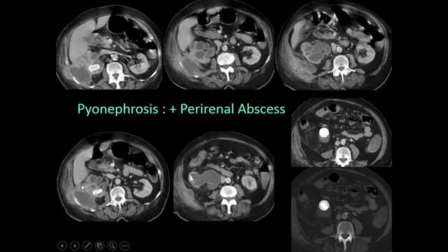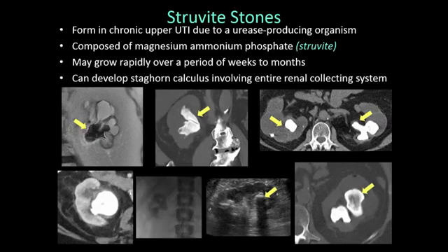It's obstructed, it perforated into the perirenal space and caused a perirenal abscess. And then the patient presents with the perirenal abscess. He had this infection for many weeks at home before he presented acutely. So that takes us just for a little bit of time to talk about stones and stones in the setting of infection. And that is the reason why urologists are very quick to take care of these stones, not because so much of the hydronephrosis, but because of the potential of having superimposed bacteremia, particularly struvite stones.